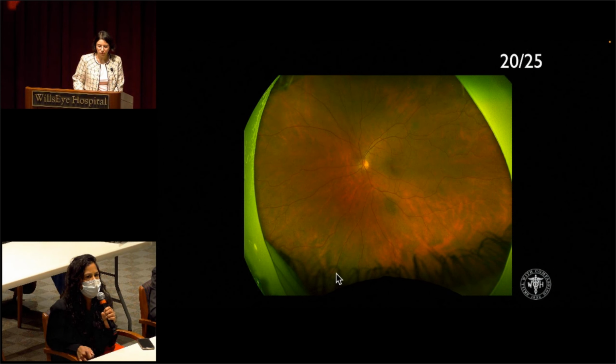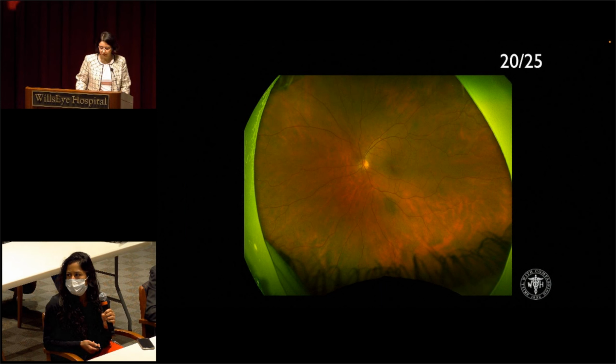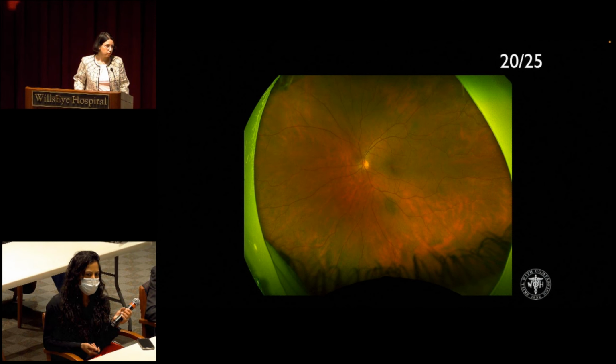I would agree with that. The one comment I'd like to make is the choroid looks a little bit dark. This is not melanocytosis, but it's probably a person with brown irides, which is a little bit unusual. You would expect the choroid to look lighter. And the question that I have is, go back to the right.